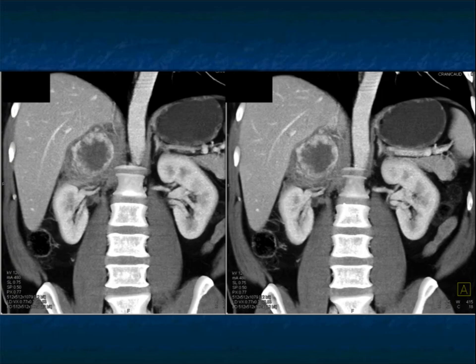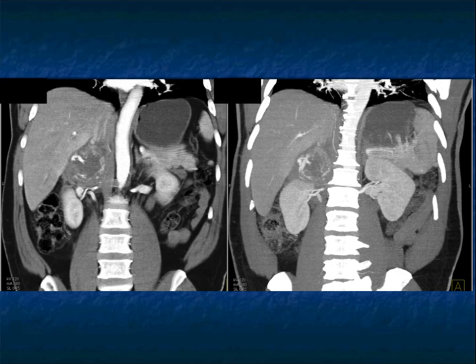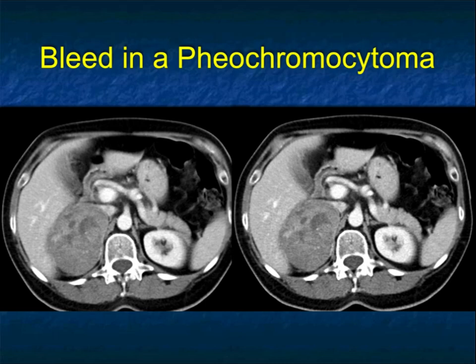When you see the infiltration around the gland, you see some vascularity, then you're going to say this is highly likely a malignant Pheo. You can see there's no easy way of removing this lesion. Now, one thing you need to consider, of course, with Pheos, just like with primary adrenal cortical carcinomas and several other lesions, including adenomas, Pheos can spontaneously bleed. Now, if this was simply a solid mass that bled, you could expect to see all of the changes around the adrenal gland. So it's not definitive that soft tissue around the gland means there's infiltration, because maybe the patient bled. Very impressive example. Look at the neovascularity, no doubt about it.